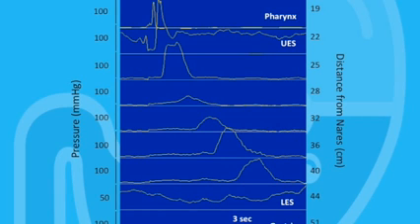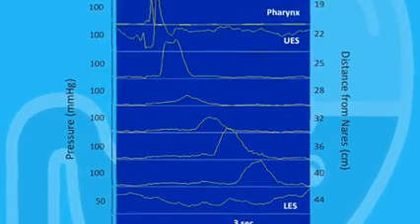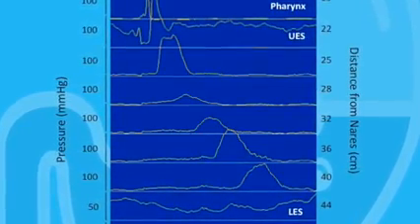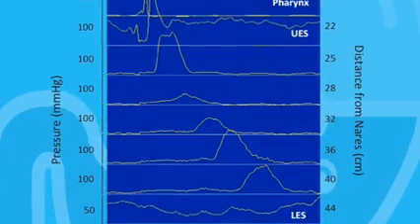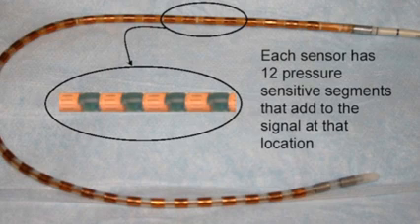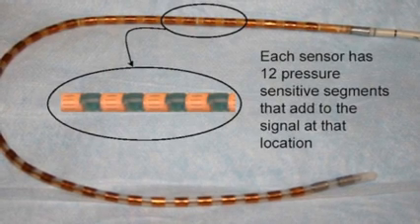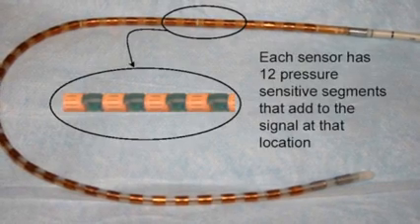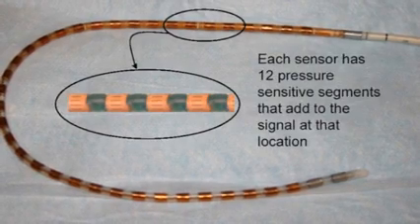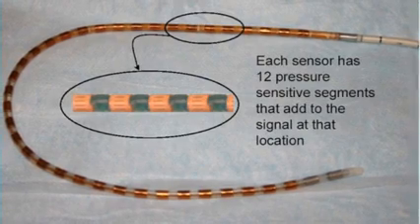Right. So, as you know, esophageal manometry has changed dramatically in the past 10 years. For example, we no longer use manometry catheters with 4 to 5 pressure sensors, producing pressure line tracings like the one shown here. Today, we have sophisticated and very sensitive esophageal pressure catheters that are capable of generating very exquisite details of esophageal motility. For example, in our lab, we use a pressure catheter like this, which has 36 sensors spaced at 1 centimeter intervals down its length.